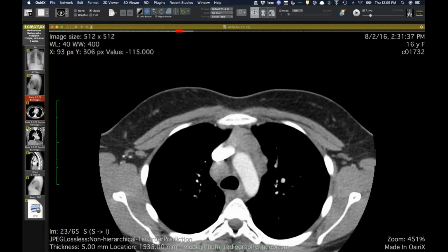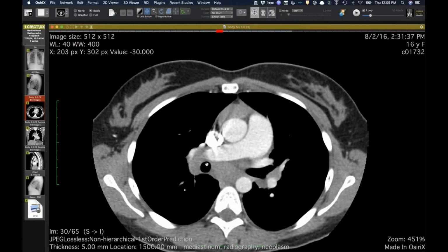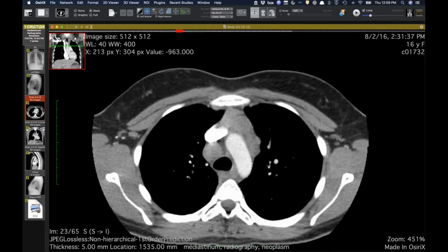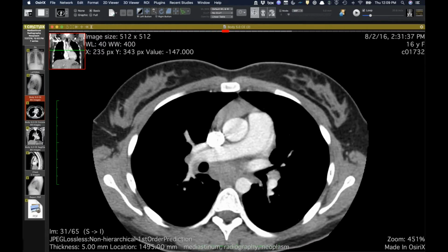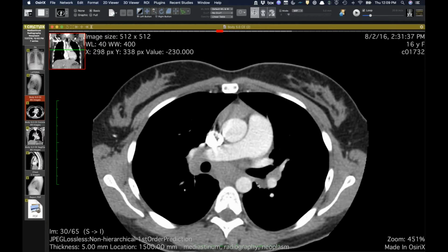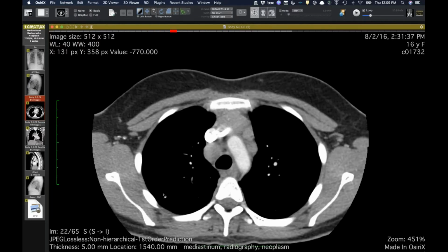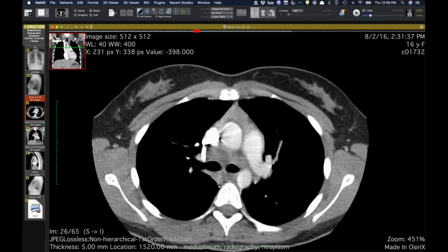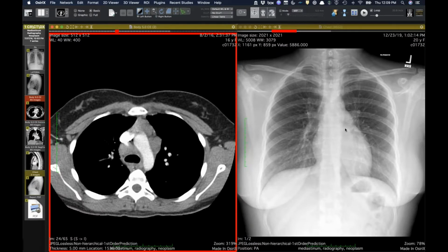But the reason I show this is I'm just curious, what do you guys think in terms of just looking at the lymphadenopathy, how high would you put sarcoid on the differential? It'd be pretty high, especially if she had no symptoms. Yeah, very high, based on what I see there. Yeah. Now, to make a long story short, cervical node biopsy ended up being Hodgkin's lymphoma. It was classical Hodgkin lymphoma at the time of this. And I just saw a recent follow-up radiograph, and her lymphadenopathy in her chest is gone too. So she's in remission now.